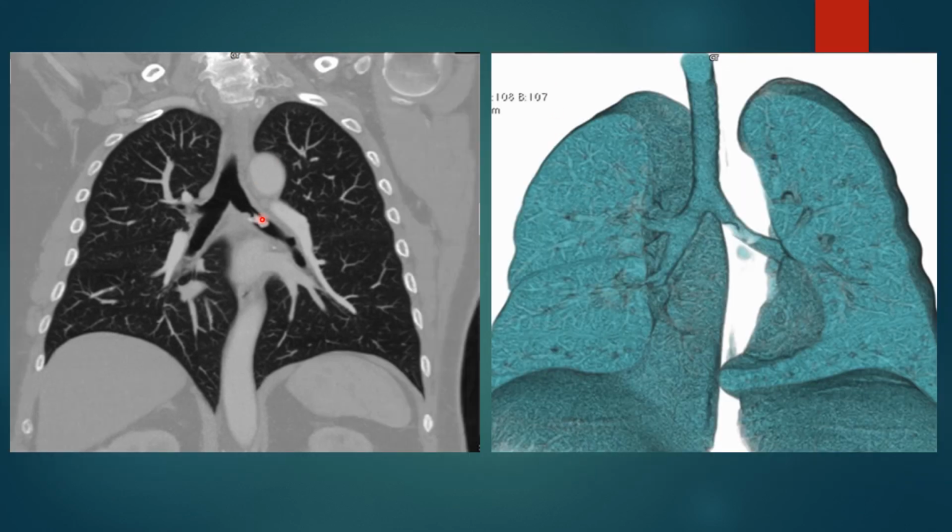And this last picture I just wanted to show you, comparing the coronal CT. One of the good things with CT is you can make these 3D models of your images. Sometimes it's a little easier to see. You can actually see the chicken bone right in here, but it is also easier to appreciate the normal lung anatomy, as well as like the trachea coming down at the carina bifurcating into the right and left main stem bronchi, how the right main stem bronchus is much more vertical, the normal anatomy of the lungs, the lingula, and cardiac notch.